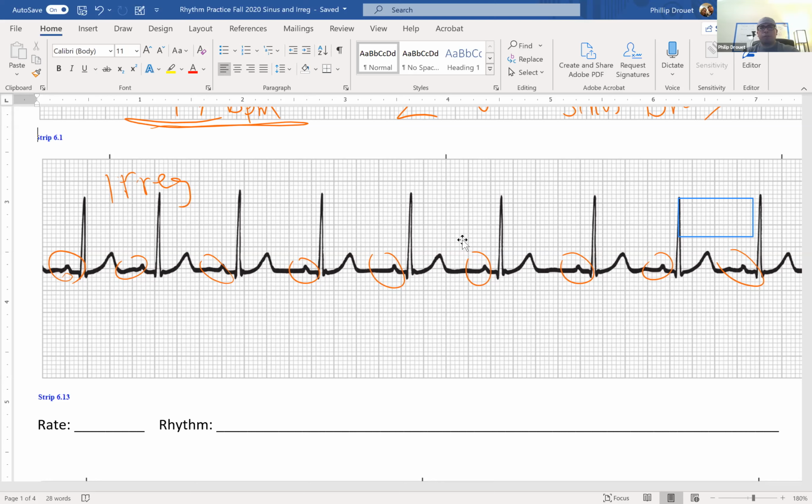But you might be thinking to yourself, well, if it's sinus, it should be one of those 3 that we've talked about: normal sinus, sinus brady, sinus tachy. But don't forget, we have a 4th rhythm that is sinus, right? It's actually not a new rhythm. It's part of an interpretation, because we have what's called sinus arrhythmia, which is a change in our regularity or change in our rate due to sympathetic and parasympathetic nervous system response or stimulation. Okay, so let's go back to this. All of your P waves do look the same, so I think this is still coming from the sinus node.